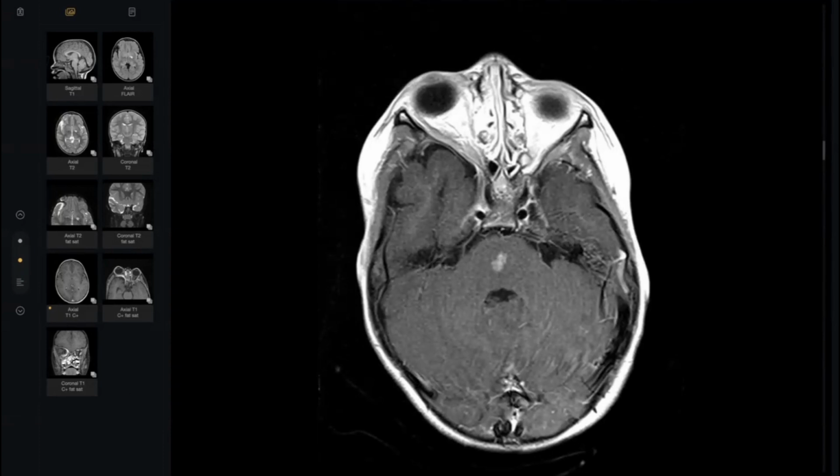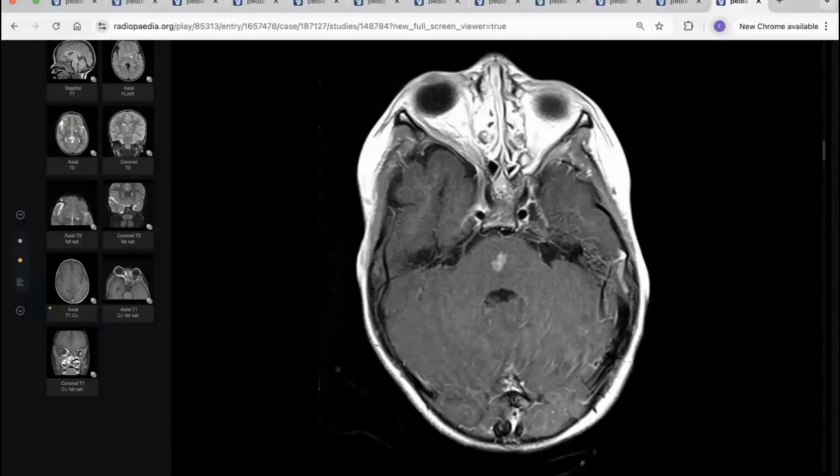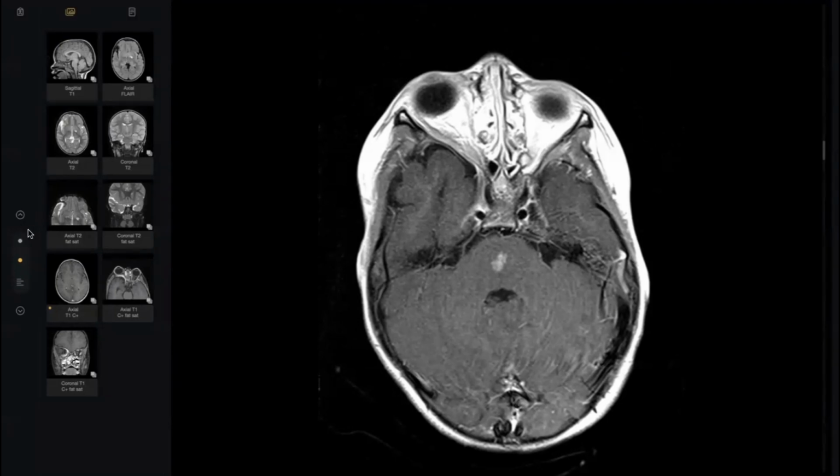Abnormal signal intensity. Focal abnormal signal intensity. Okay, so give me a diagnosis. Conclude neurofibromatosis type 1. Okay. And you will do the usual examination for the family, for the whole neural axis, and genetic counseling. Okay, thank you, doctor, so much.